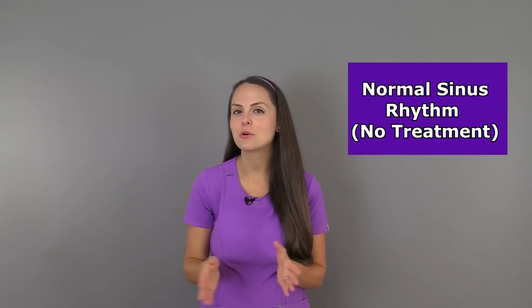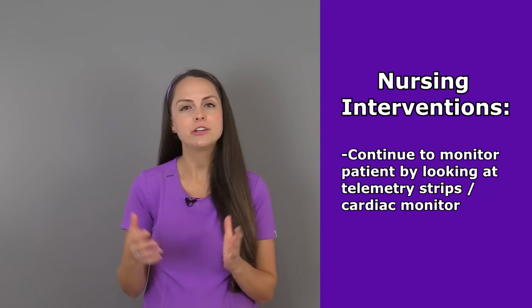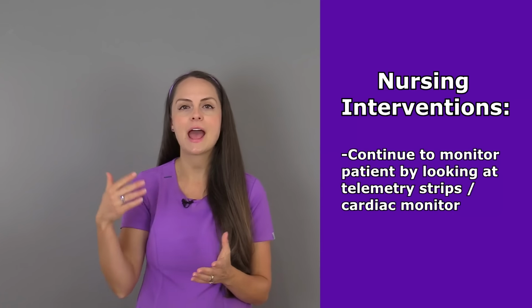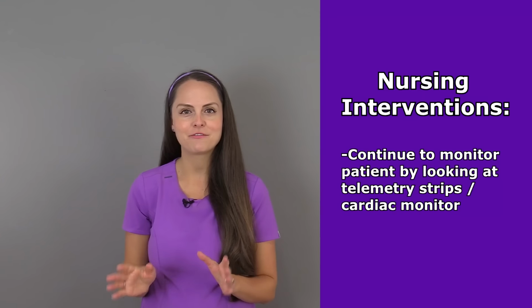So whenever you're looking at your patient's heart rhythm and you see that they meet all that criteria for normal sinus rhythm, that is a good thing. This is a normal rhythm and it requires no treatment. Therefore, as a nurse, you want to just continue to monitor your patient by looking at those telemetry strips, looking at the cardiac monitor if they're on one, just to make sure that they're not deviating from this rhythm.